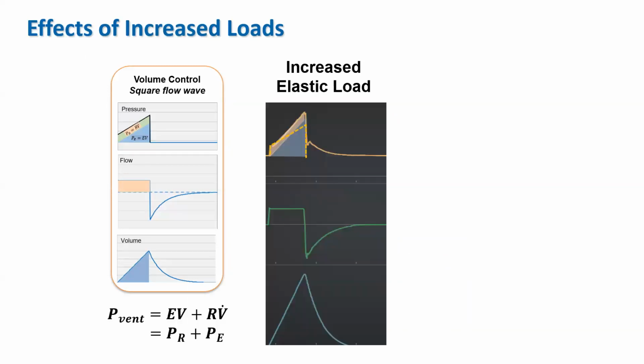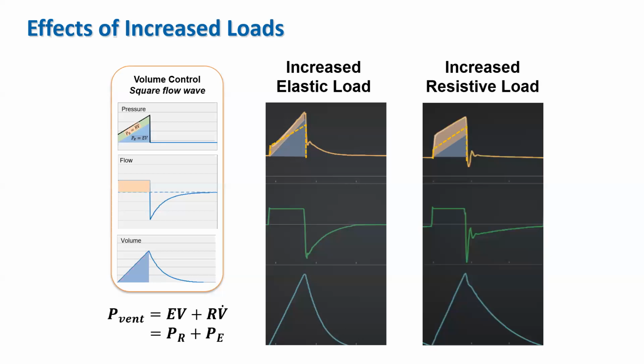This figure shows the effects on the waveforms of increased elastic load in volume control with a constant inspiratory flow. This figure shows the effects of increased resistive load.